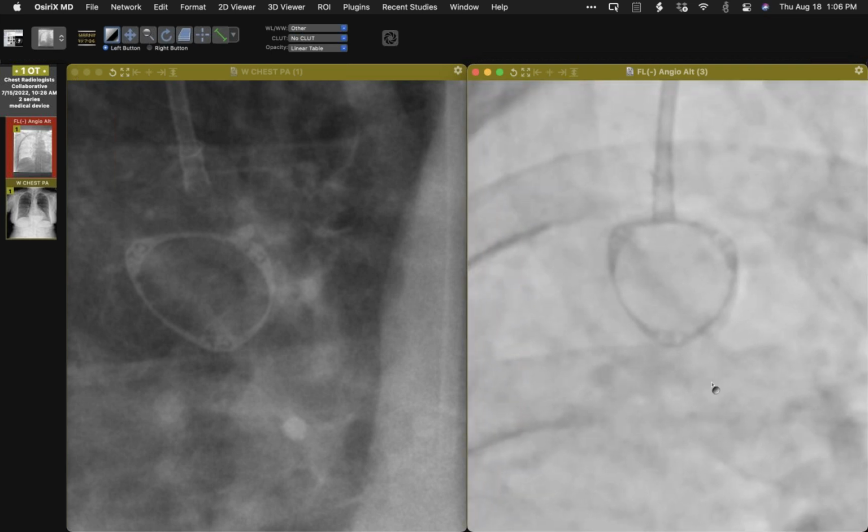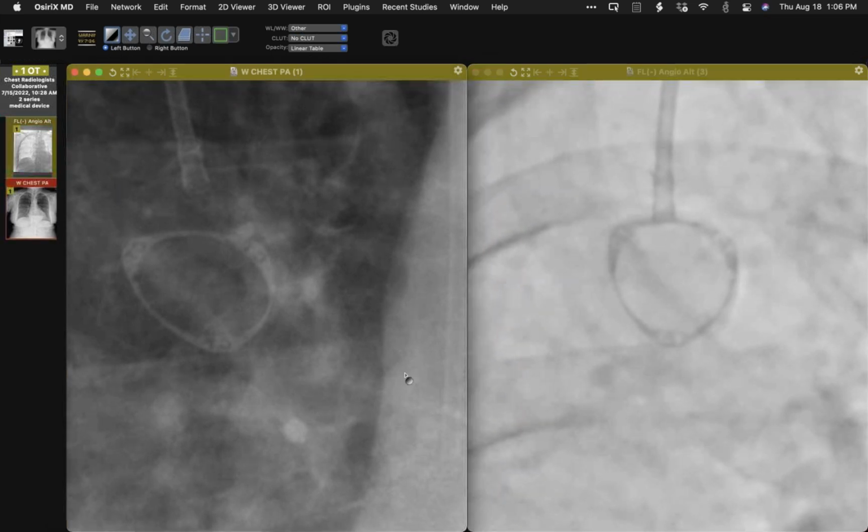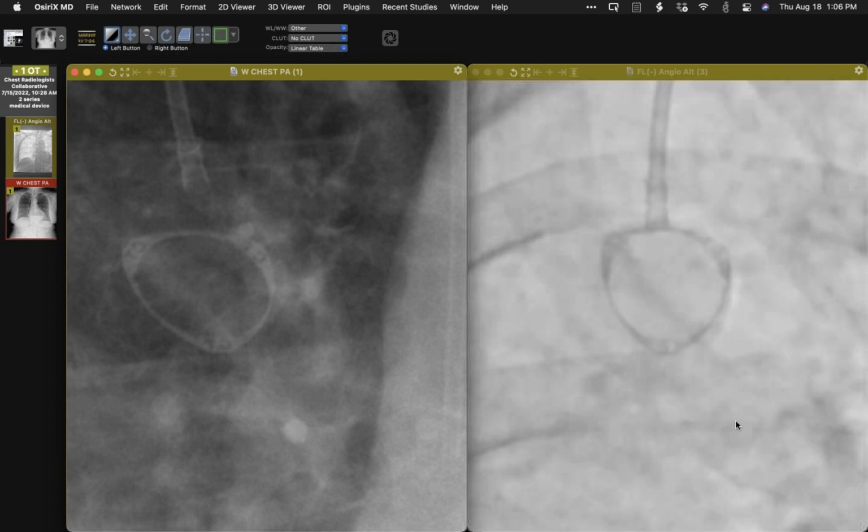I don't remember what the product name of this particular port is, but you can see that there. David, I think you'll like that one. You've shown us these before, right? Yes, indeed. Nice example. Yeah. It's a great one. Very nice.